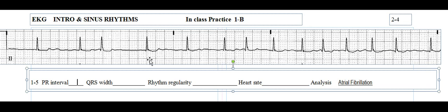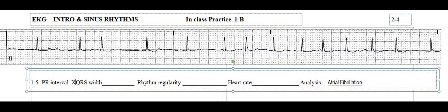There's none here. Okay, so you've looked at all the P areas, and we don't seem to find a P. Therefore, they don't have one. What do we do? I just mark that off with an X because there are no P waves here.